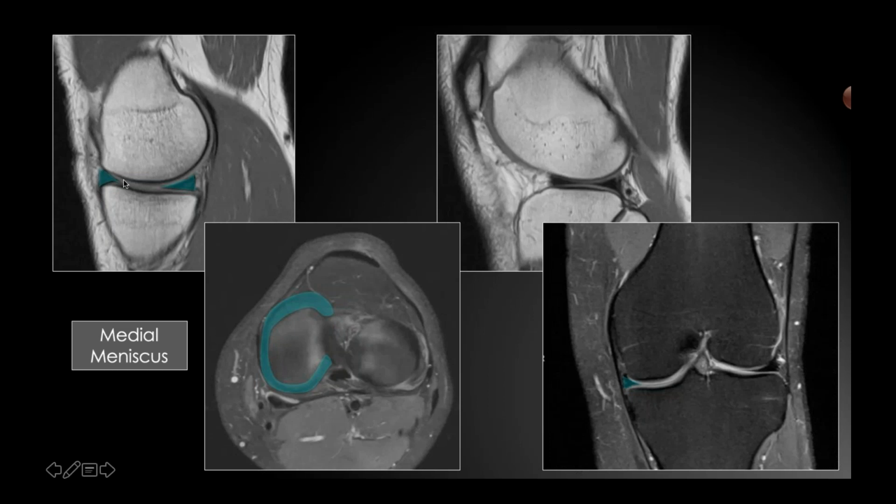And the meniscus always shows up as these nice sharp triangles. So I always tell our residents, remember how you drew a triangle in kindergarten. These should be nice sharp corners, all right? Because we're going to see some abnormal examples here in a minute. And one of the first things you lose are those points of that triangle. So here's that medial meniscus.